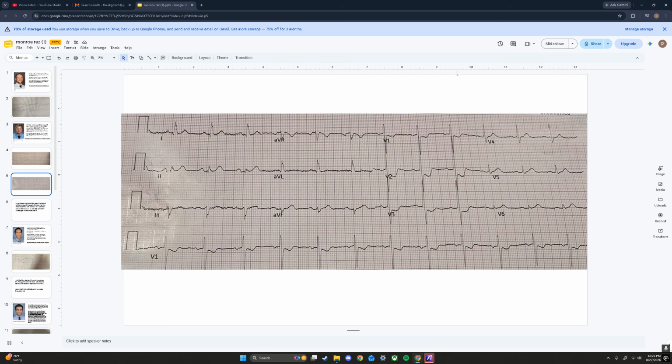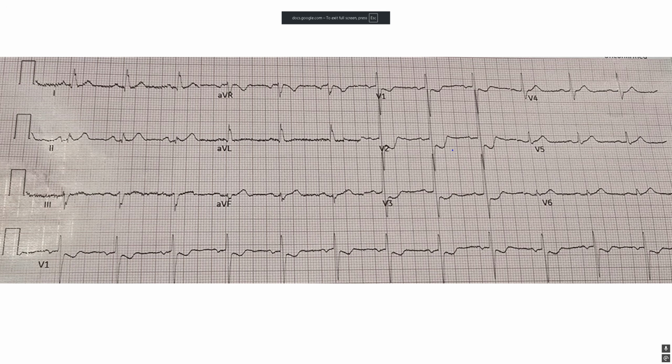He sent me another case with no history, zero history. He's like, yo, just check out this EKG. All right, so let's check it out. Again, Zach, your hospital sucks. Why are you guys using rhythm strips as V1? Our scale is on here.